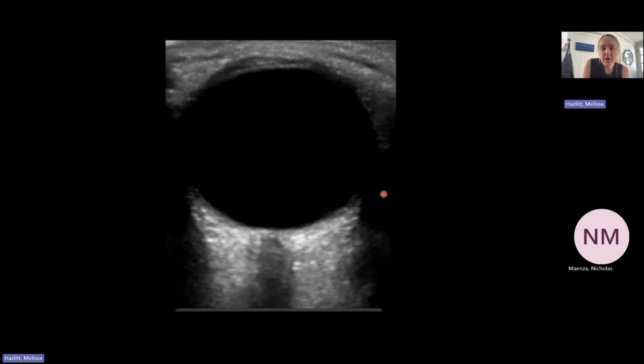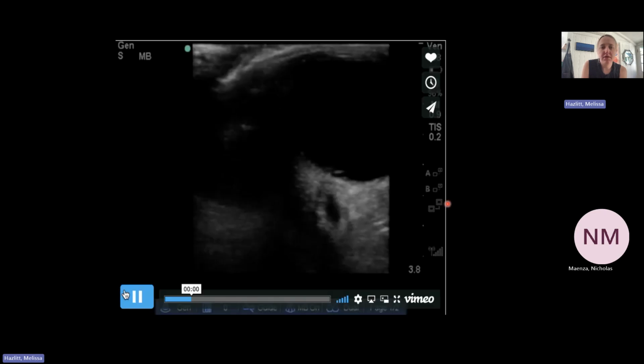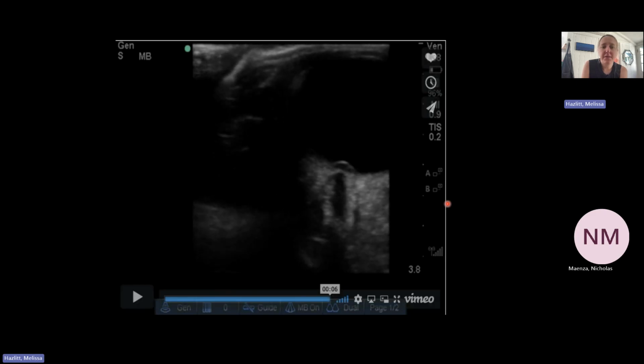So in these ones we were looking at historically, it's just very flush. Whereas in these, which are all patients that have papilledema, you can clearly see the optic disc, or the optic disc nubbin, as I like to call it. If you were to measure it, my guess from just looking at it is that it would be greater than 0.6 millimeters, but those are very small numbers that we're working in. And as you can see there, you're actually seeing the optic disc.